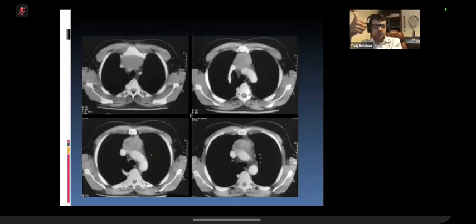It's quite simple, isn't it? There are only 3 things to keep in mind: lymph nodal soft tissue, thymic tumor, goiter. It's not goiter because it's quite high. It's a bit too low. It's less likely to be a lymph nodal soft tissue mass, although still possible, because we are seeing one large soft tissue mass rather than multiple conglomerate lymph nodes.